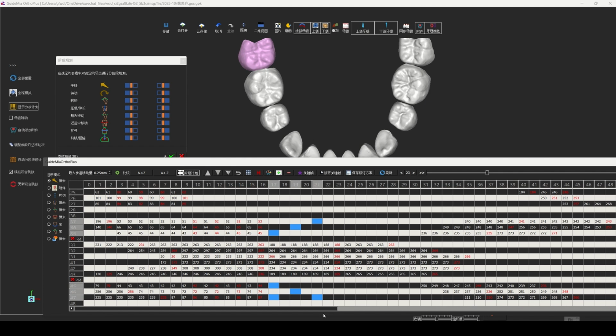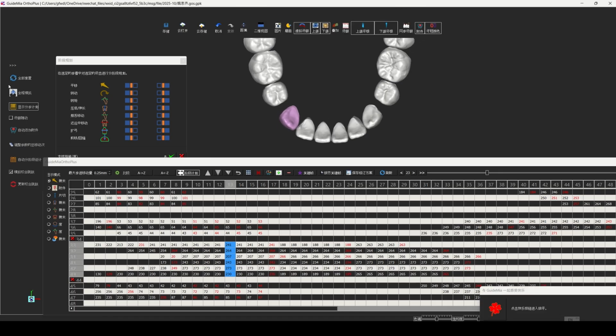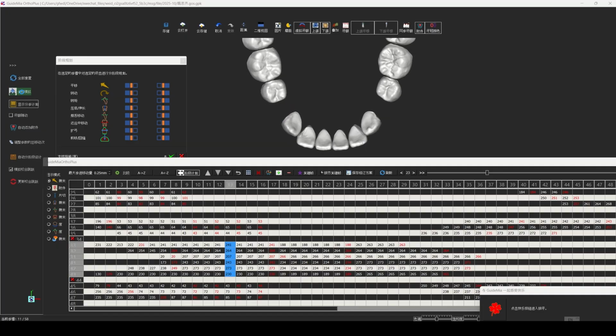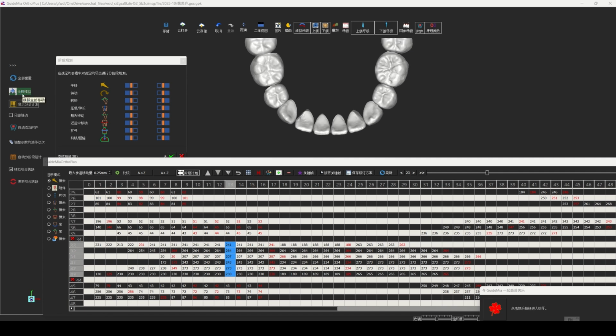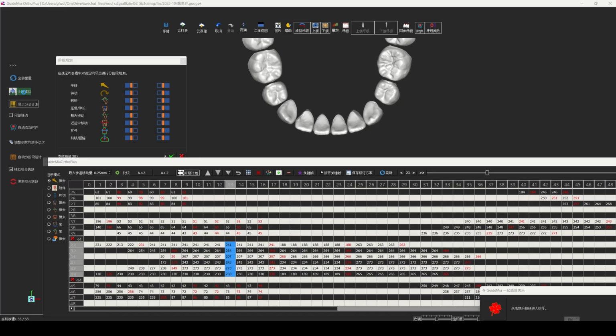This button is to adjust the movement. You notice for those steps, we're having higher movement amounts, bigger than 200 microns. So we can adjust the steps or insert steps so that each of them will be in the given range of 0.25 millimeters actually. Now we are running the simulation. We can see anterior first, molar expansion first, anterior movements next, and then molar movements. And for each of them, you will see rotation first, translation first, that kind of movement orders.